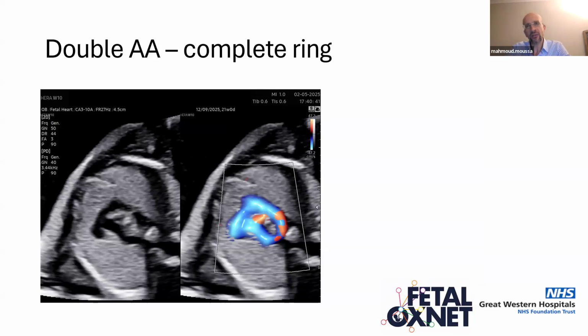So always be careful. The right aortic arch can sometimes be misleading for a double aortic arch. So always check the plane clearly. Obviously, there are other clues for diagnosis, and you can get other sagittal views or other views to confirm your diagnosis, but it's as simple as this.